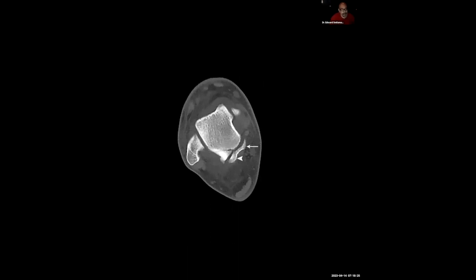Approximately 20% or so of talar fractures are going to involve the posterior process, okay? And these are thought to be due to direct forced plantar flexion of the foot, resulting in a compression of this posterior process between the talus and the calcaneus and tibia, or sometimes it can result from direct trauma of the posterior ankle, okay? These fractures, when they involve these facets, okay, here, obviously the lateral with the fibula here and the medial, okay, are going to be called respectively the Shepherd's fracture when it involves the lateral tubercle, and Cedell's fracture when it involves the medial tubercle. But again, here, notice here how the flexor hallucis longus tendon sits within its groove, okay?